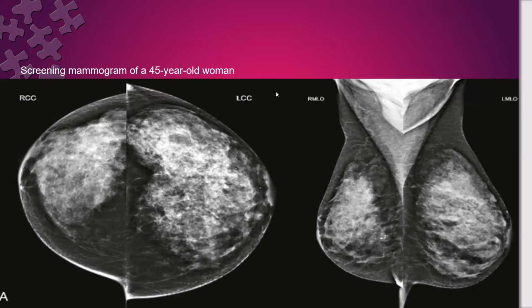Continue. You said, this is vague, Sumaya, when you tell me one breast is smaller than the other or one breast is larger. Tell me exactly which breast is larger or which is smaller, and what do you think about this asymmetry? Is it significant? Is it not significant? Is it just associated with other findings? How are you going to manage the case? That is the way.